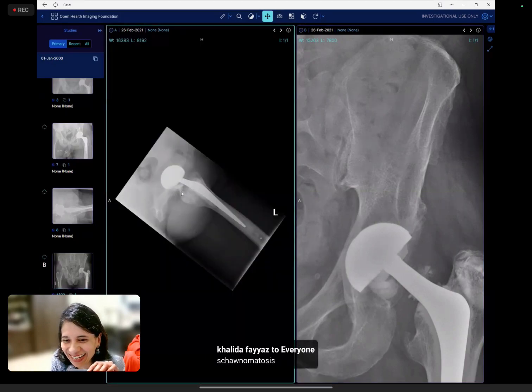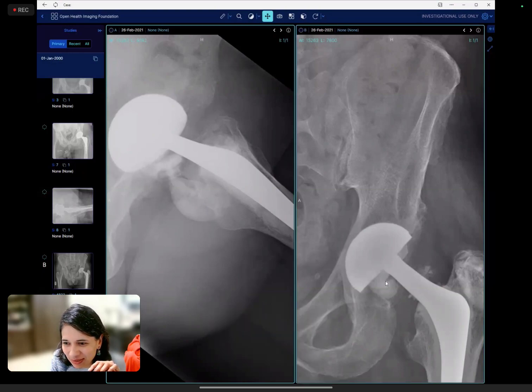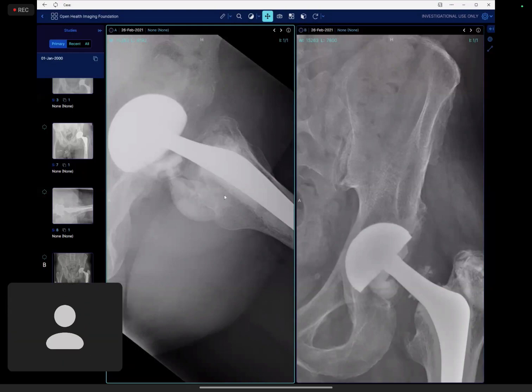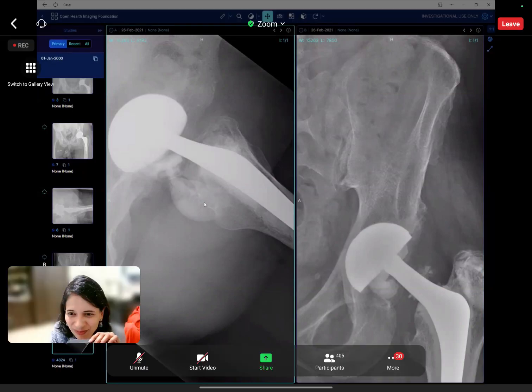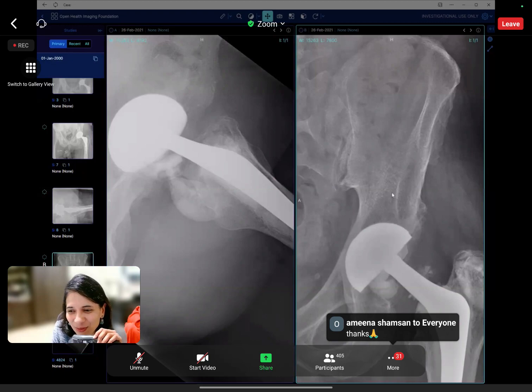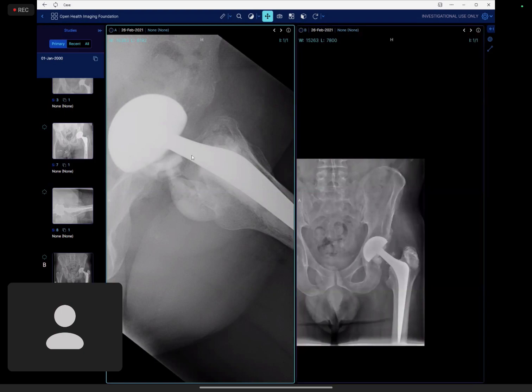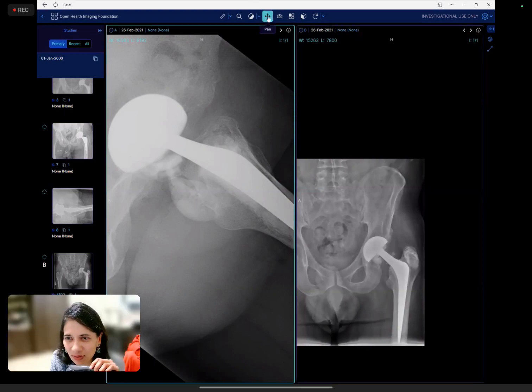And I had to say, do you want to look at the lateral? Because I was trying to show you this. If it's the head, then you shouldn't see this at all. Because it's the liner, you can see it's the shape of the thing, and you can see that it's more linear than circular, like for the head. That's what I was trying to show you on the lateral. So please ask for the lateral. I want to know whether in your normal practice you look for the lateral. So please do that. And otherwise, yes, you said all the right things.